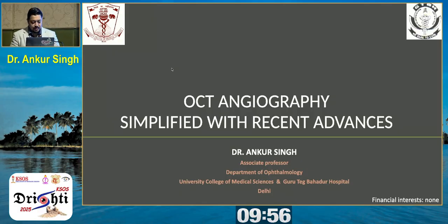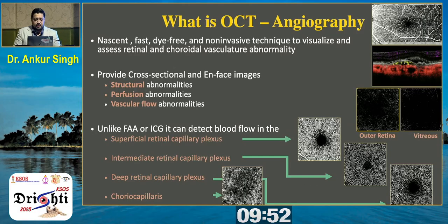Thank you, Dr. Anju. I'm going to talk about OCT angiography. So, why OCT angiography? OCT angiography is a nascent, fast, dye-free, non-invasive technique to visualize and assess retinal and choroidal vasculature abnormalities. It provides us with cross-sectional as well as en-face images to detect structural, perfusion, and vascular flow abnormalities.